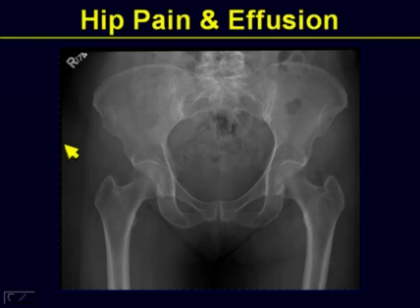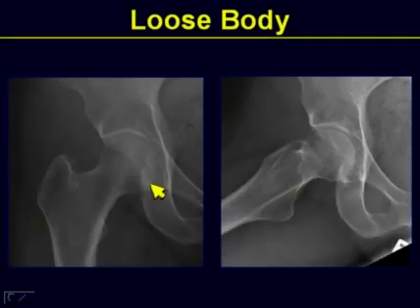One more time, until we identify it on ultrasound or sometimes on radiographs, we probably wouldn't guess right away which hip is involved. But once we ask the patient to continue with another frontal view, cone down view, accompanied by a frog leg lateral view, we appreciate that in the translation from the AP view to the frog leg lateral view, there's a persistent radiopaque density at the lateral aspect of the subcapital joint.